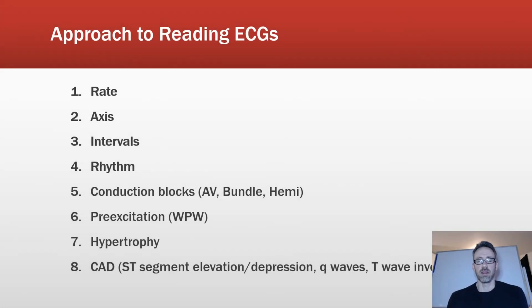So in this video on ECG, we're just going to practice our approach to an ECG and go over some examples to get an idea, at least, of how to assess an ECG on a very basic level. So first I want to talk about the approaches that we can take. On this first slide here, this is probably one of the more common approaches.